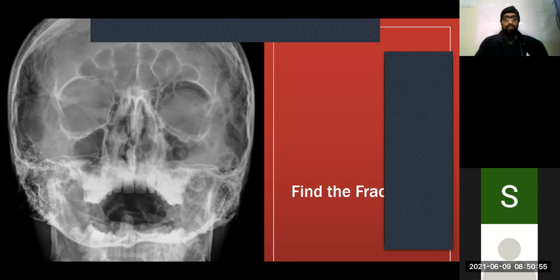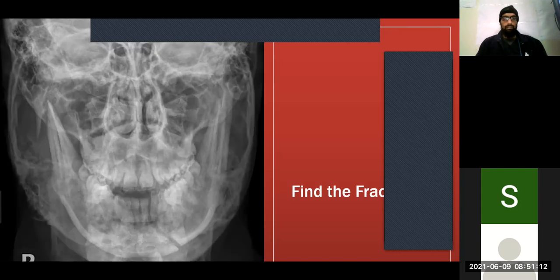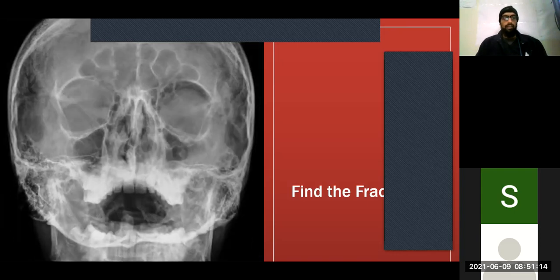All right, let's look at line number 3. So we're going through that part. Do we see anything? Not really, eh? Let's try our more complicated lines. Let's follow it absolutely exactly. Do we see anything? Not really. Oops, sorry. Let me go back. That was my mistake. Let's go to line number 2. Let's follow across. What do we see?